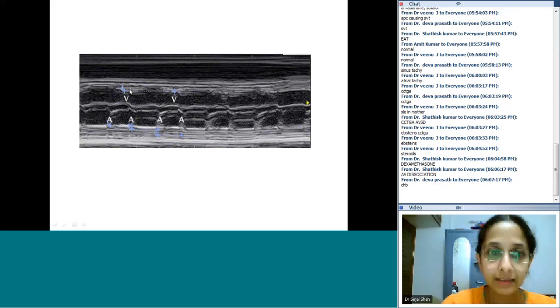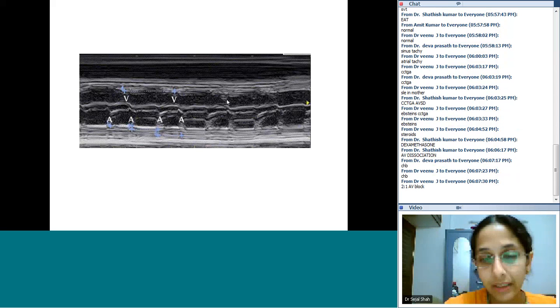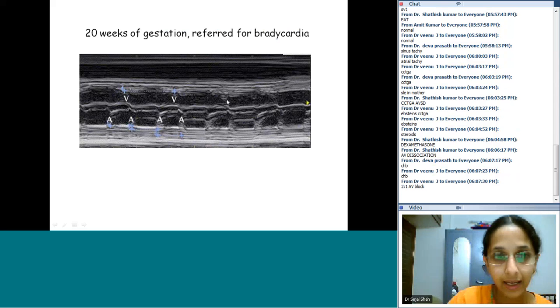As we discussed some time ago, it is a little difficult to figure out complete heart block sometimes. So I would agree that whenever the atrial rate is more than the ventricular rate and there is related bradycardia, you would consider it to be a complete heart block. If you look a little carefully, you will see that this atrial rate is not regular. If you could see this atrial activity, this PP interval is not regular. This PP interval is a little bigger than this PP.